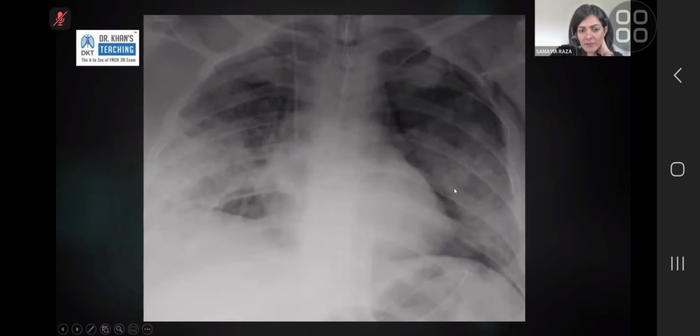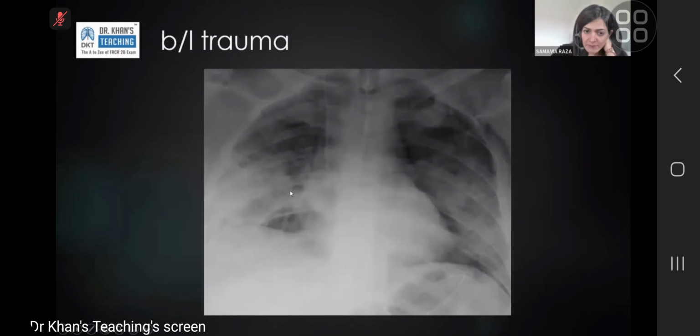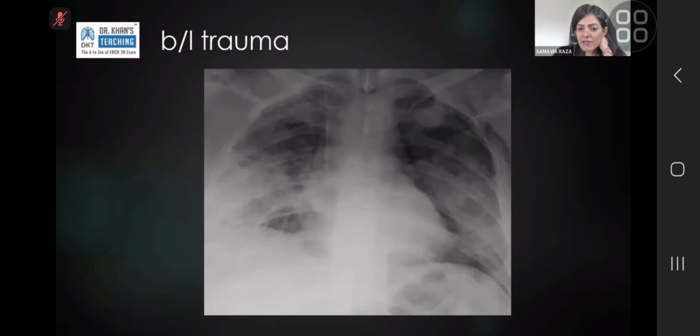I think most of you said pulmonary edema. I think that's the most common finding. All of you would put this down as that, but somebody had said subcutaneous emphysema and pneumothorax and consolidation. So in the context of subcutaneous emphysema, pneumothorax, and consolidation, you have to consider that this could be a hemorrhagic process. This is actually significant trauma. This is actually crush trauma on both sides, and this is really bizarre because you can't actually see the rib fractures. So it's very reasonable to call it as pulmonary edema or heart failure, but this is actually bilateral lung contusions and trauma.